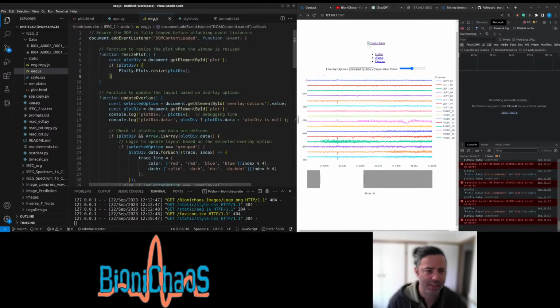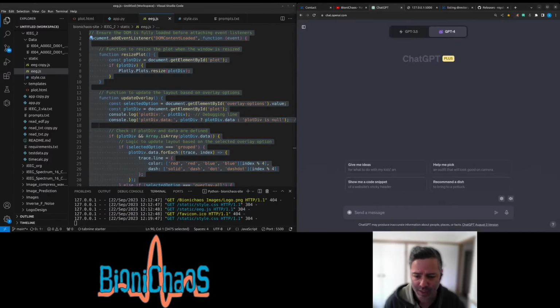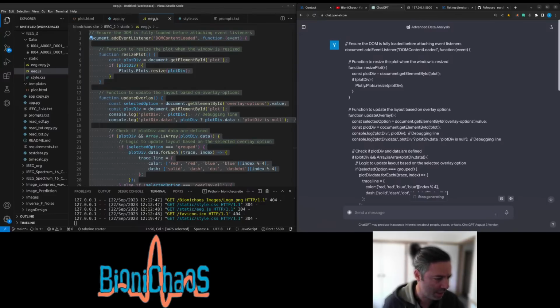Yesterday, my best understanding is that there's some sort of compatibility issue between some of the Plotly functions that this code is using. Maybe they were updated, so something wasn't back compatible, so things don't work. But let's pop this code in quickly. We want our intern to not sit idle.